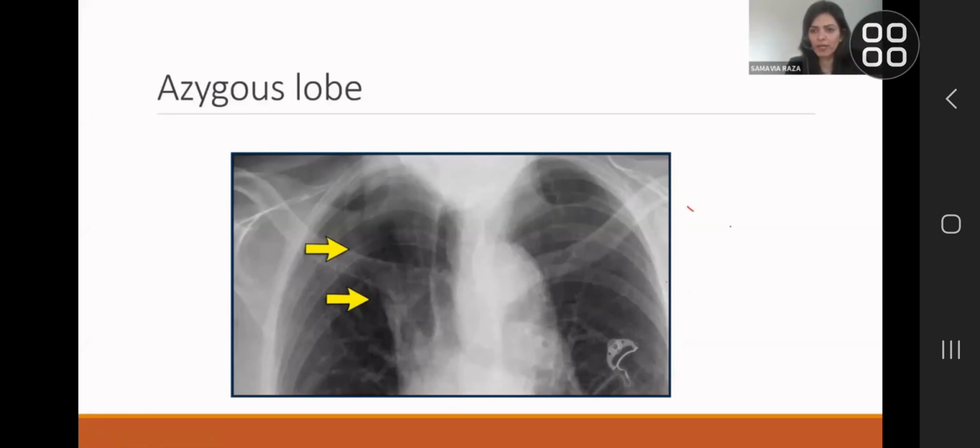So for the right upper lobe to collapse so much that the normal fissure has gone all the way up, this would be completely radiopaque. So it would be white. This is clearly a smooth thin line, and this part of the lung clearly has air in it. So this is normal lung and this is normal lung, and the only fissure or line it can be is the azygos line or lobe or fissure, however you describe it.